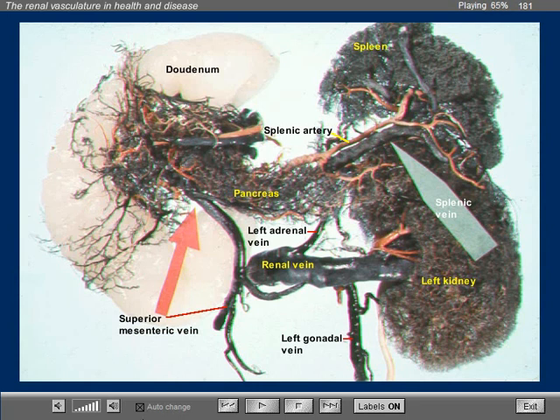Note that the splenic artery runs along the upper border of the body and tail, and just caudal to it we can see the splenic vein. We can see the proximity of the left renal vein to the body and tail of the pancreas. And we can also see, as later will be better described, extensive venous communications between the body and tail of the pancreas with the upper pole of the left kidney and with the left adrenal gland.